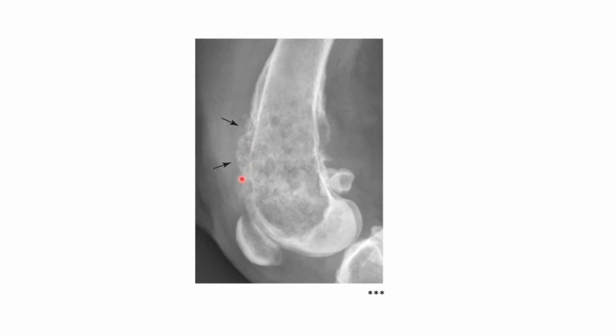So there's certainly some evidence of cortical destruction. And we've got this associated periosteal reaction, which is quite irregular on both the cranial and the caudal aspects of this distal femur. The zone of transition is difficult to see, so it's long and indistinct. So this lesion is metaphyseal.